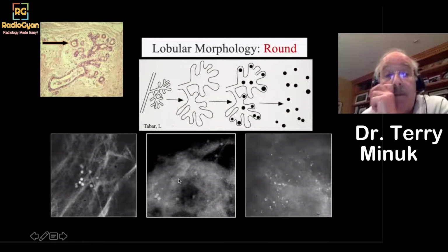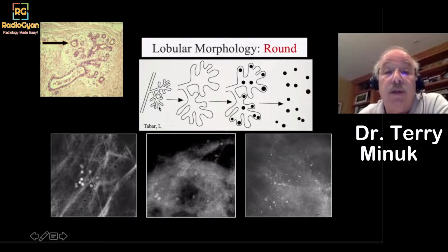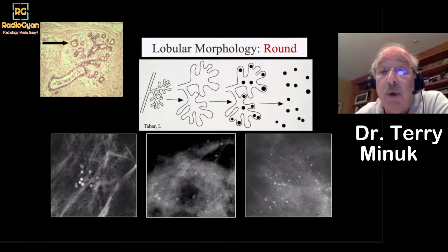Now, a normal TDLU will get calcifications in the acini in many people. Initially, the acini balloon out and get filled with fluid. You get calcifications that float around in those acini. On a lateral view, they may layer out. But at some point, the acini atrophy, usually age-related, the fluid dries up, and you're just left with the leftover calcifications with no fluid. And we call them involutional calcifications.